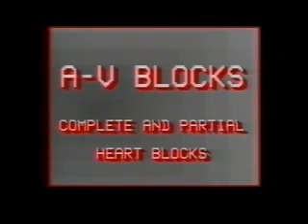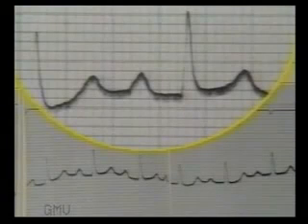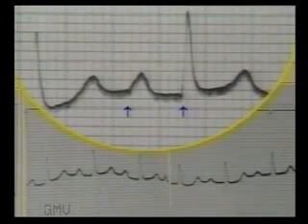AV block, complete and partial heart blocks. First degree AV block, or first degree partial heart block, is a block in the AV node. In this ECG, measure the PR interval. It is 6 small squares, or 0.24 seconds. The normal range for the PR interval is 3 to 5 small squares. So this ECG shows a prolonged PR interval, indicating delayed conduction from atria to ventricles.